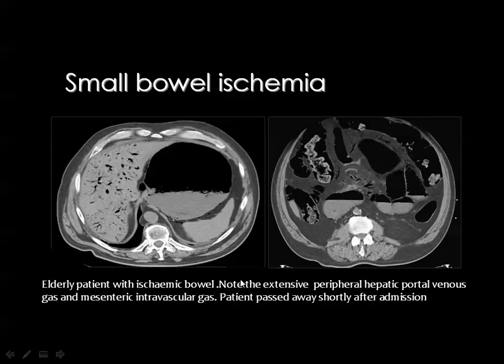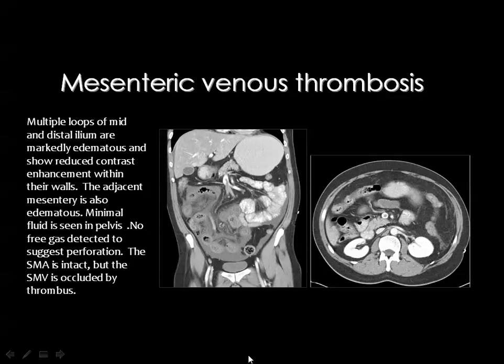Then this is a case of small bowel ischemia with dilated small bowel with air fluid levels, as well as air in the wall and air in the portal tracts. And as I have said, this is a very bad sign, and the patient usually dies shortly after admission.